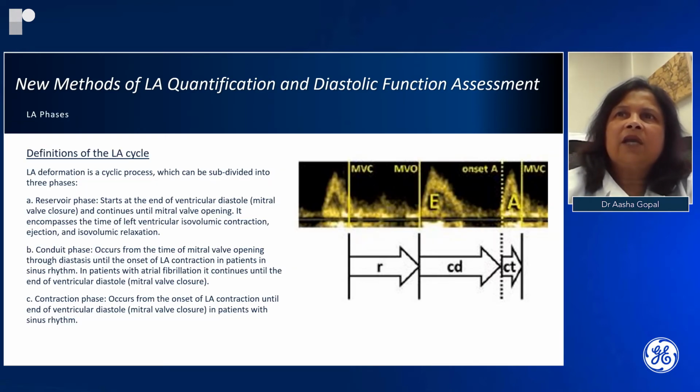Now we can correlate these three phases of left atrial deformation to the timing intervals on the mitral inflow spectral Doppler profile. The reservoir phase begins with mitral valve closure up to mitral valve opening. It includes isovolumic contraction, ejection, and isovolumic relaxation.